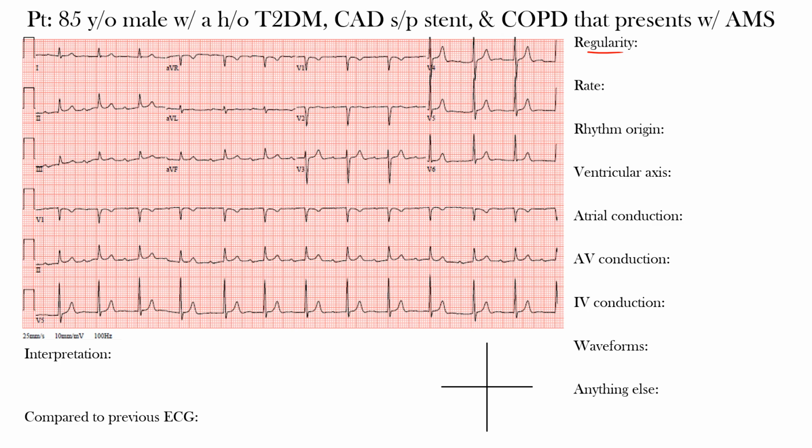Now, I want you to pause the video and take a few minutes to go through it yourself. When you're ready, start the video and we'll go over it together.